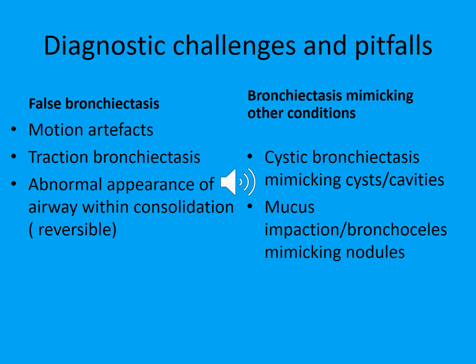Diagnosis of bronchiectasis on imaging is not always as straightforward as it may seem. There are conditions that may mimic bronchiectasis in patients who are short of breath and cannot hold their breath. The motion artifacts can mimic bronchiectasis. Also in the lingula, the motion of the left ventricle can mimic bronchiectasis.